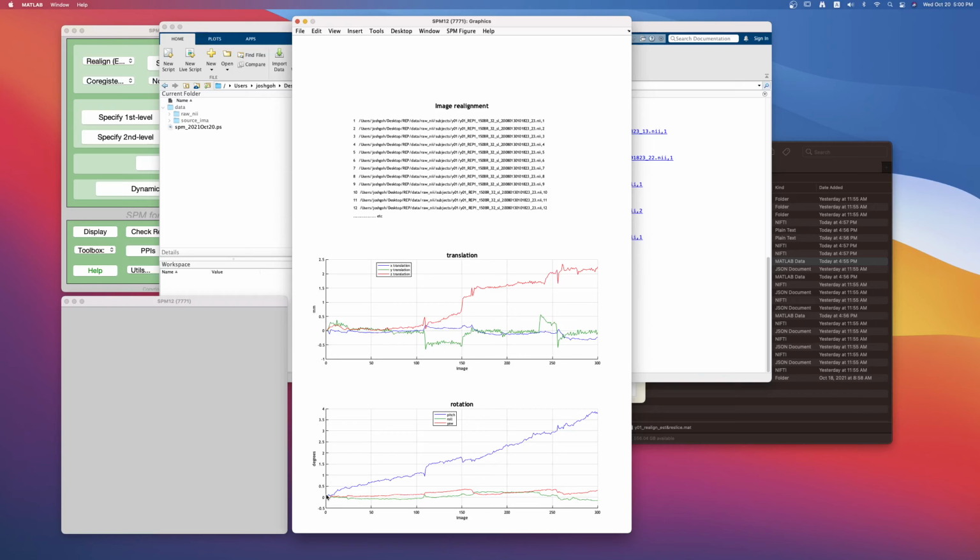But in this case, although it went from 0 to 4 degrees of rotation, that's when you take 2 sessions together. If you look at just one session, it was well within maybe 3.5 or 3.4. So it's more or less acceptable. It's really not too bad. And maybe actually 2.4, 2.5 or something of degrees of rotation. So overall, this subject should be okay. I wouldn't reject this subject.